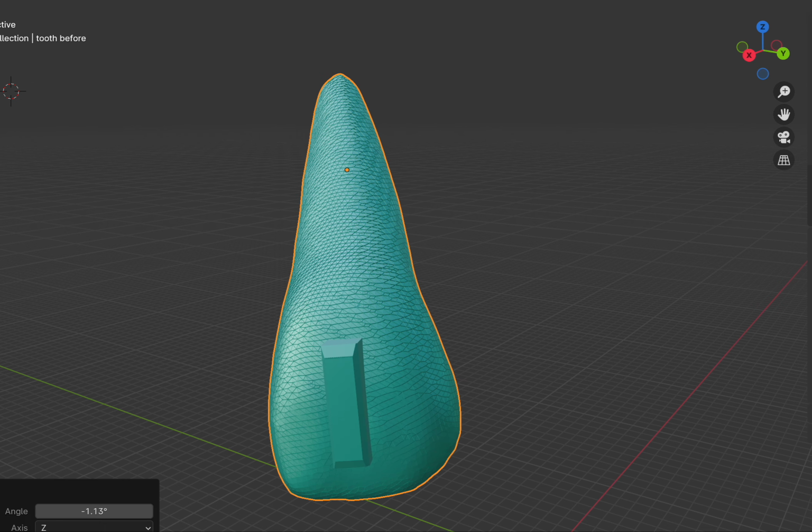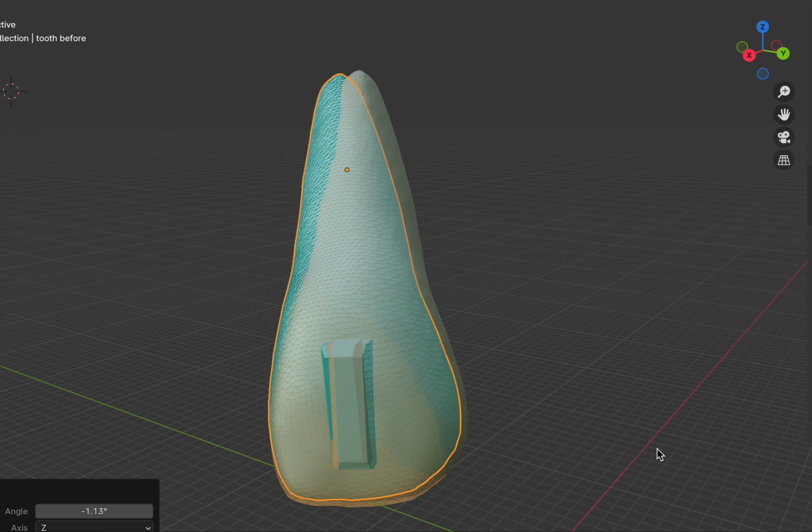And then if we put the aligner back on, you can see that now we have some contacts, and now the attachment has been activated by the aligner material, which obviously should be as super elastic or elastic as possible to create the counter moment necessary to get an uprighting of the tooth and get the translation.